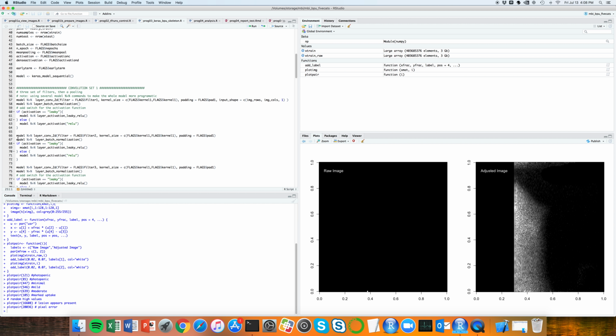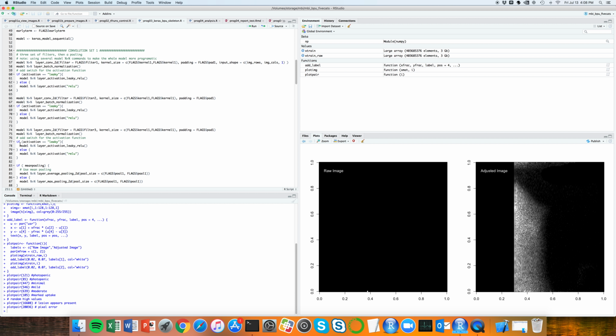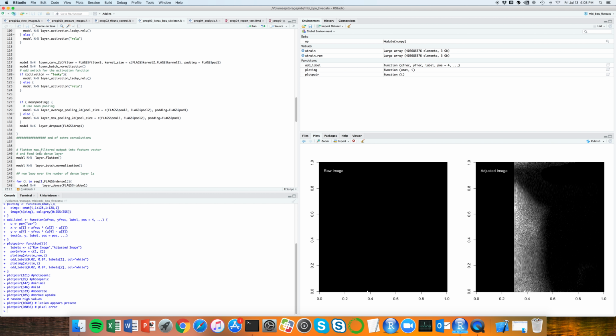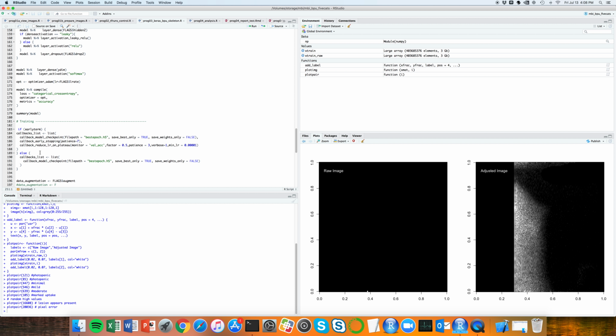I did learn, while it looks redundant, to keep specifying model. It allows me to easily do things like some if-then logic and piece together a model without any complicated command line parsing within R. You go through here, you can do all the normal things you can in Python.